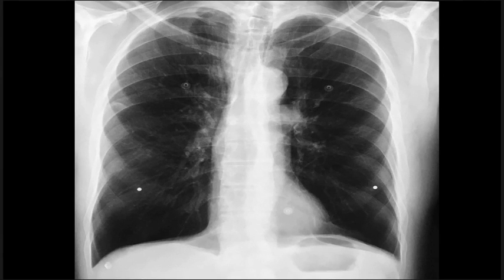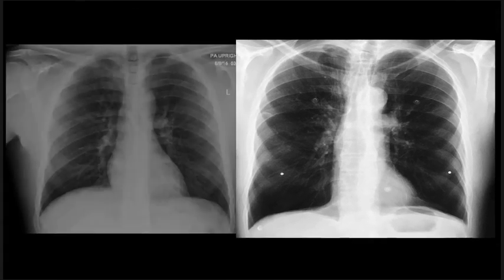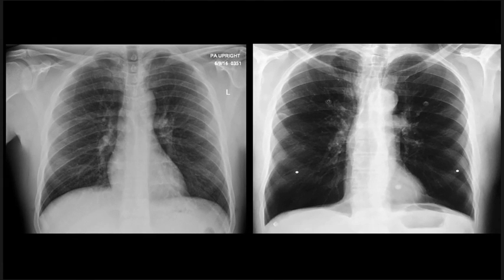Now let's move on to a few new potential pitfalls, things that we haven't talked about before. So here we have a radiograph. Now I'm going to compare this to the normal. Just bring in a totally normal radiograph, different patient. I want you to look at the right heart border on the normal. See how that sort of sticks out? It's real sharp. You could easily draw that with a pencil. So you can only draw that line if you're clearly able to identify the right heart border.